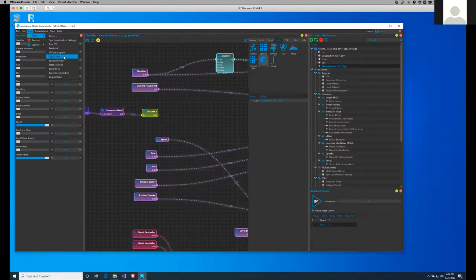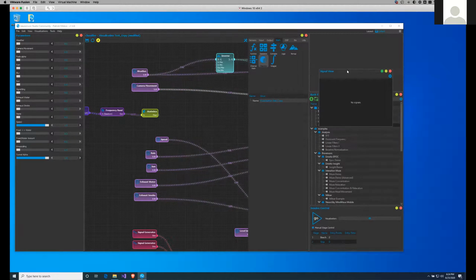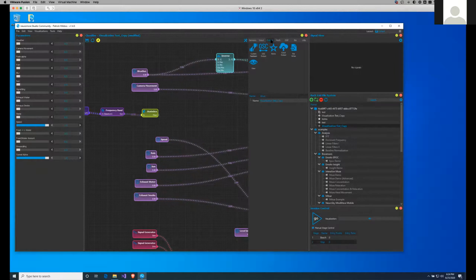And we do that by adding a signal view window. So let's just put it up here. And under output nodes, we have a view node, and it's pretty simple. Whatever input you connect to that particular view node, it just draws it, you know? And now we see, all right, the alpha mean for our test feedback system is currently between 15-ish and 89.